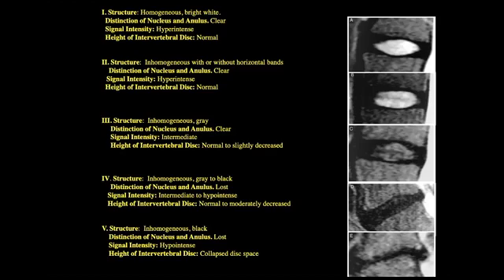So looking at these discs, in terms of identifying which one is a potential pain generator, it would be really challenging based on just the features here. What we can tell you is that A and B are not pain generators. So a normal looking disc is not typically a pain generator. And also in my experience, E, an end stage disc, because by that time you're almost auto-arthrodesed or fused. There's not much motion there.